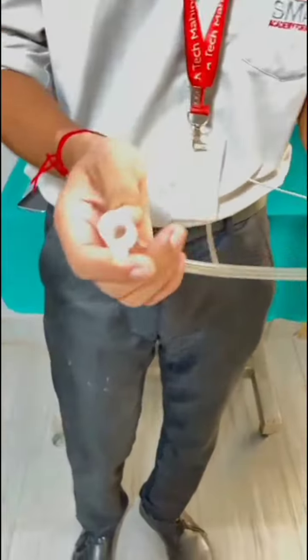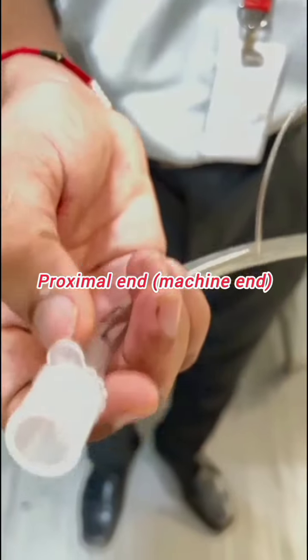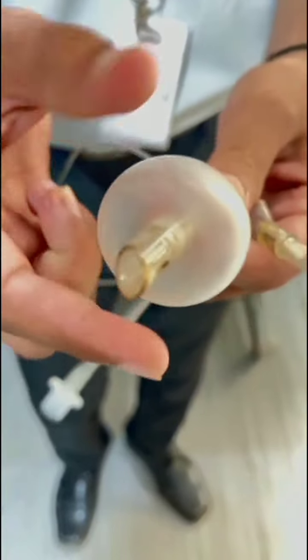So basically, ET tube has two ends. This end is called the proximal end. It connects with the machine, and this end is called the distal end.